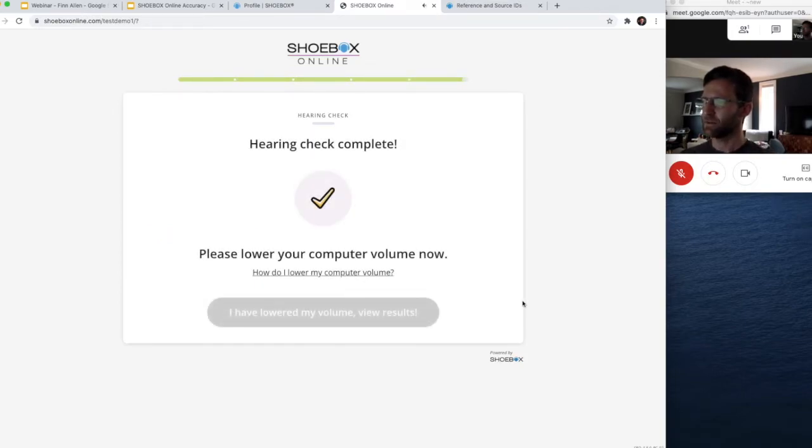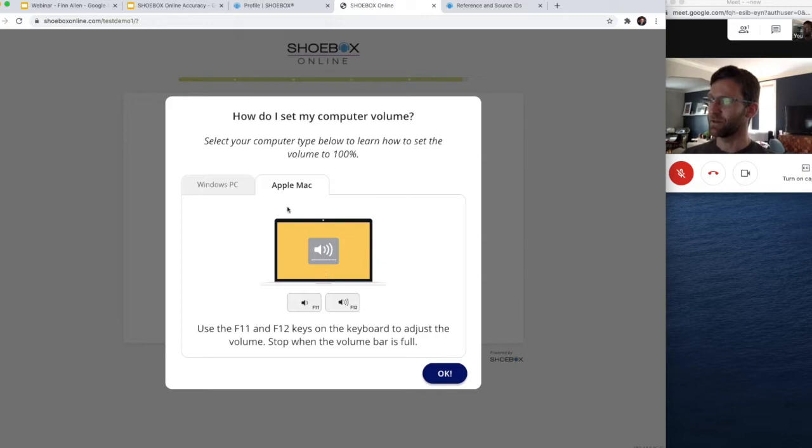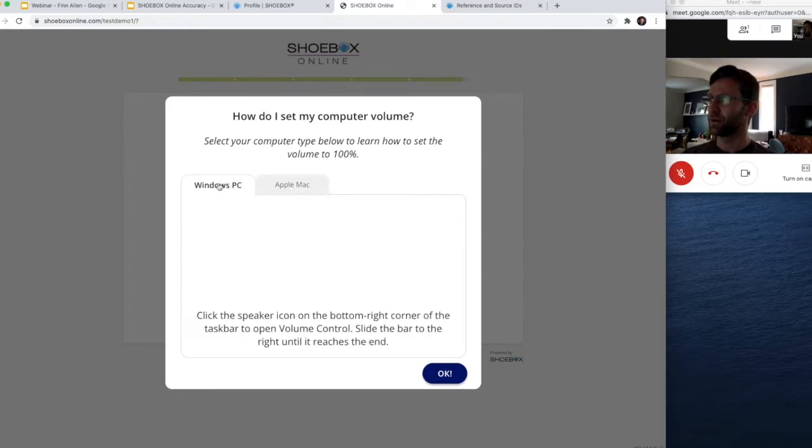At the end of the test, we pause here and we ask the user to return their volume down. We want to make sure that, next time they take their phone call or they listen to music or they get a notification, they have corrected their volume because we did ask them to turn their volume up. We even tell people how to turn their volume up and down.